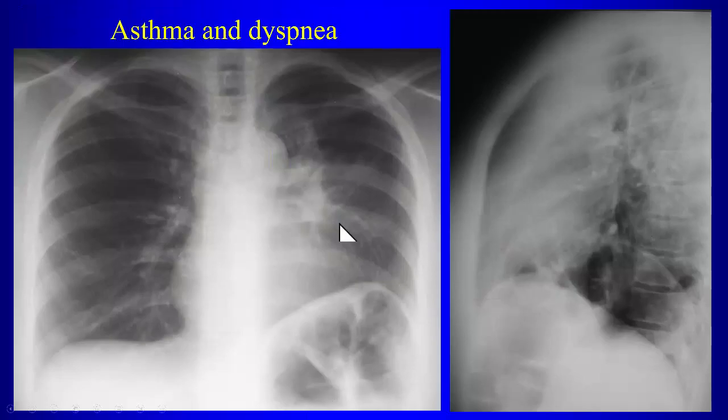Very similar story, right? So again, we have the hilum looks fuzzy, maybe a little elevated. Notice the diaphragm is elevated. Notice also we lose the left heart border. Why? Why do we lose the left heart border in this case? Well, what's the diagnosis? Yeah, again, it's left upper lobe collapse. You can see the major fissure here is deviated anteriorly. This is the collapsed left upper lobe.